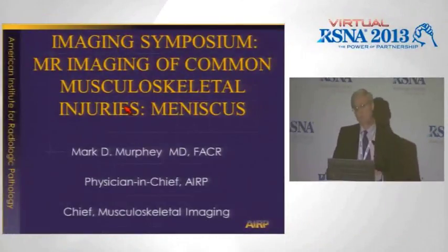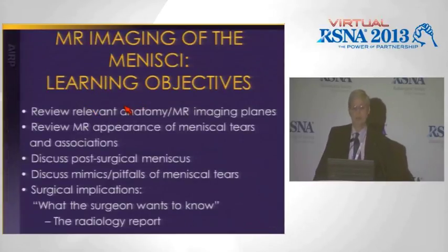Well, thank you for staying. I'm going to talk about menisci. I spend about half of my time doing clinical work at Walter Reed, and we really see a high volume of sports medicine injuries. So that's where this material comes from. I will do a little bit more of a case-based format. So I'll show you cases as we go through this, but I'll start with just a basic approach to menisci.